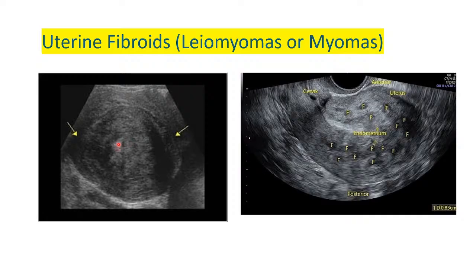When we say heterogeneous, we say that the tissue of the fibroid is not uniform. Some areas are bright, there are darker areas there. But in terms of the composition, it's almost having the same echogenicity as the rest of the uterus. So this fibroid is almost isoechoic. If you look at the back of this fibroid, you can see that there is posterior enhancement, the brightness that we are having there. A lesion or a mass that enhances posteriorly is mostly a sign that it's a benign mass.